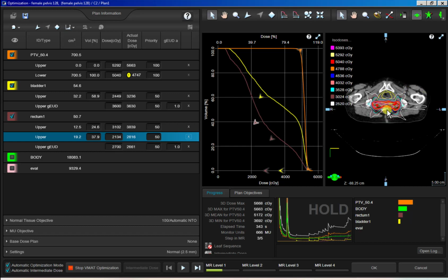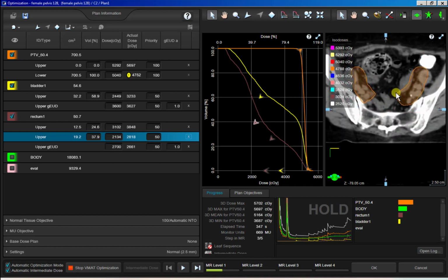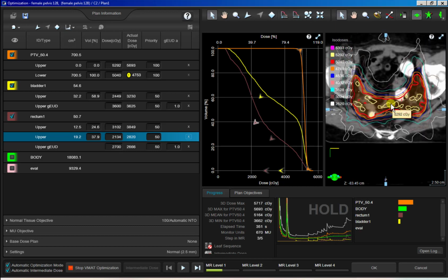So I'm just shaping it out. I'm looking at my dose. I'm looking at my DVH, and I'm trying to get this plan to look as best as I think it can based on the anatomy we're given and the volumes we're given. After you do that, then you're going to want to look at your constraints and start pushing on those specific locations, right?